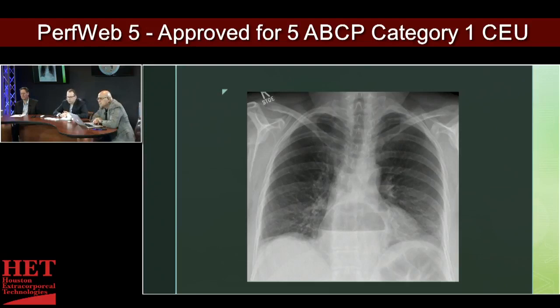So this has a particularly interesting finding here. We can look and see that the bone structures are fairly normal, nothing obvious here, which is very rare that we see it in our line of work, that we see abnormalities with bone structures, etc. Soft tissues. So we've identified the trachea. You can see the left and right borders of the heart. You can see the diaphragm looks fairly normal. There are a couple of subtle findings here, and it's something that you alluded to just a few minutes ago. What are some of the abnormal reasons to have an acute interface between white and dark?